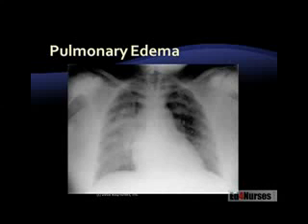The lungs are fully expanded, but you got this white, cloudy, fluffy looking kind of thing going on. You see that? How it looks like fog. It looks like you're looking through fog. That's pulmonary edema. Notice that we've got this white, cloudy, fluffy looking stuff going on up about 3/4 of the way on the right and about maybe 1/3 to halfway on the left. So this patient has some really pretty severe pulmonary edema that's going on here in this patient.